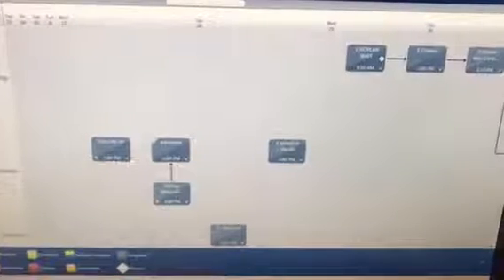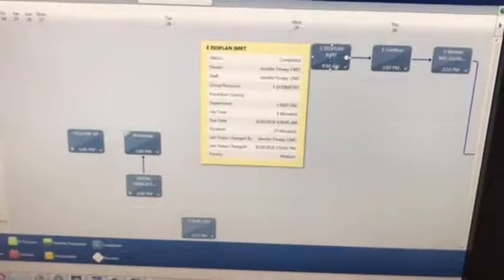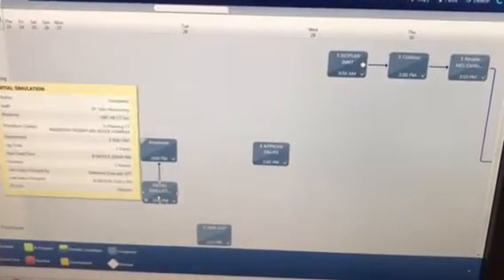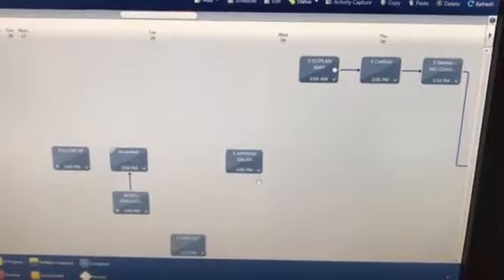So this is an example of a care path. Essentially you can do several things through care paths. The most appropriate thing for physicians is really in relation to dosimetry and physics, but you can also do things with billing, insurance, as well as timeouts and things for the therapists that are integrated into these.